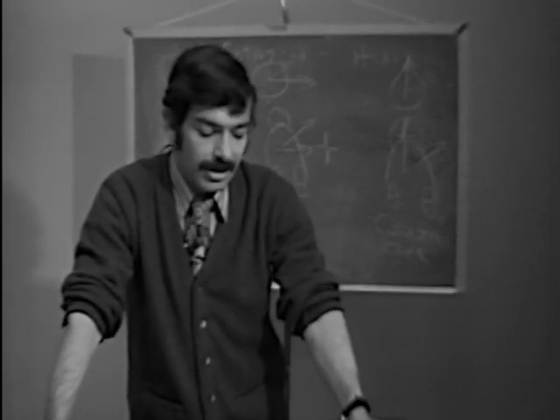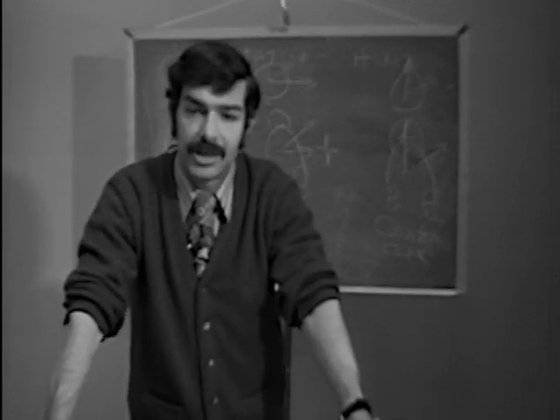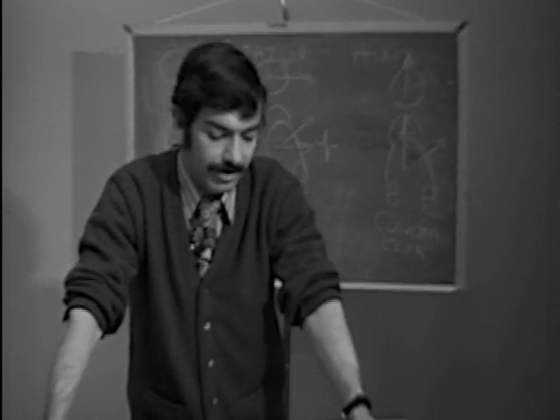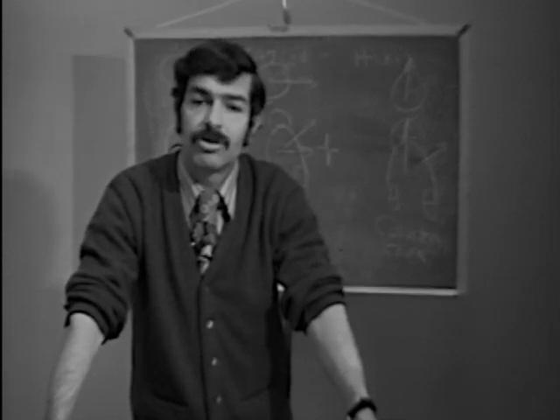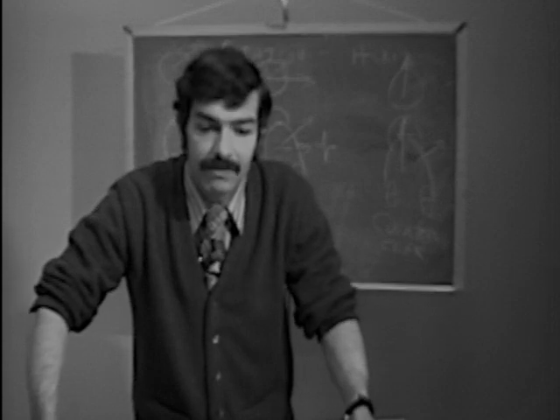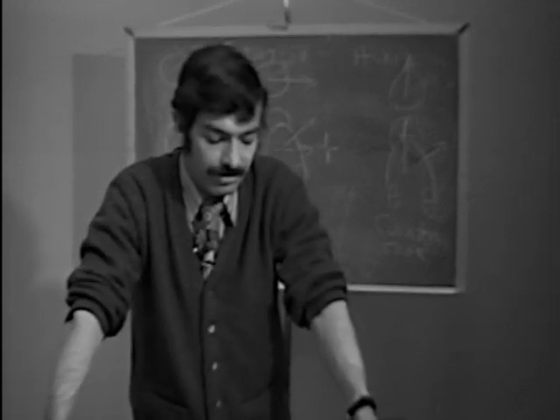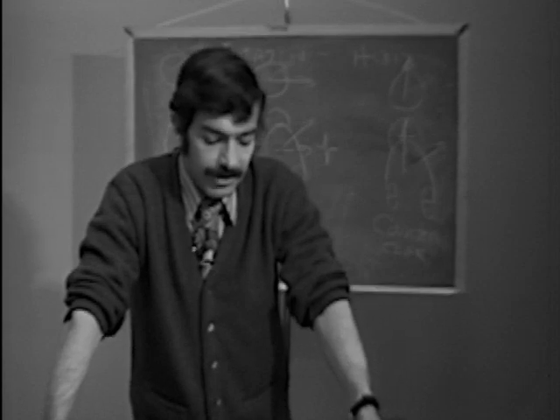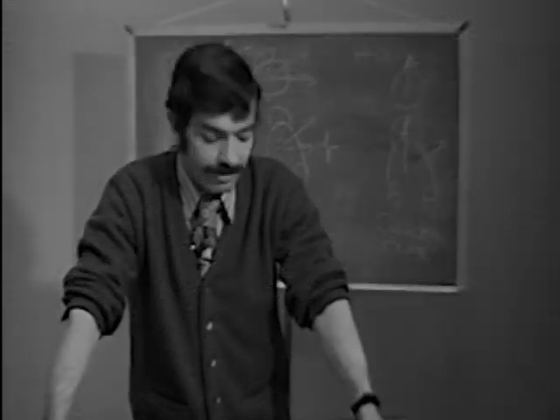And then another important thing that you have to learn is axis. Axis just has to be known. Another very important point: normal R wave progression. This is something we're going to be looking at in every electrocardiogram. You just have to know the normal R wave progression. T waves, you should know what a normal T wave is and what an abnormal T wave is.